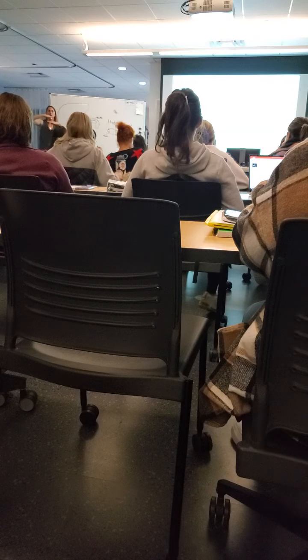Okay, so duct dilatations. We can have intrahepatic, and we'll talk about this in pathology, but that's where we get dilation within the liver itself, and it will be adjacent to a portal vein. So we call that the double barrel sign or the shotgun sign. Is it local or diffuse? Is it just here, or is it diffuse out of the whole liver? And then extrahepatic biliary duct. So we're going to go downstream. Is it because there's a stone in there, or because there's a mass compressing on that area, not allowing our bile to flow?